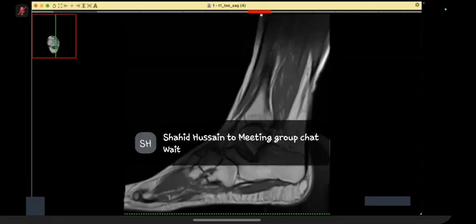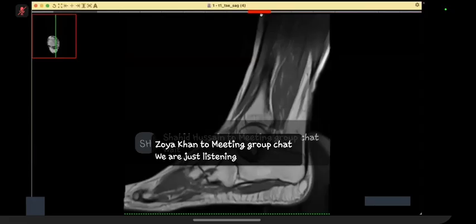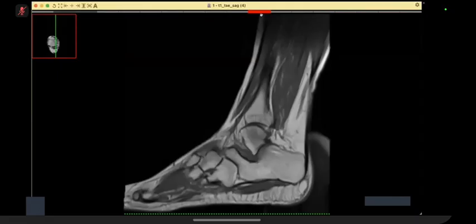Now, the best view to diagnose talocalcaneal coalition is an axial view, unless it is a very gross bony coalition, which can also be seen on the lateral view, which I'll show you. This axial view is usually not performed unless there is a suspected fracture of the calcaneum.